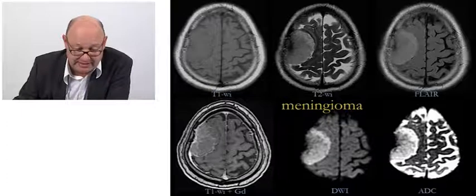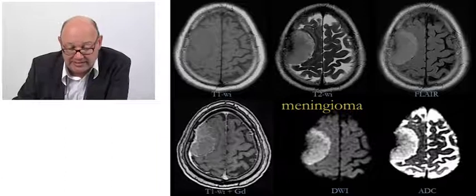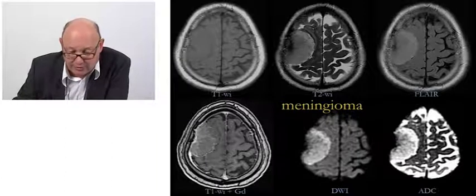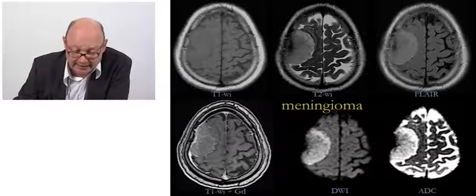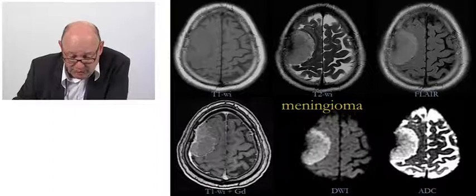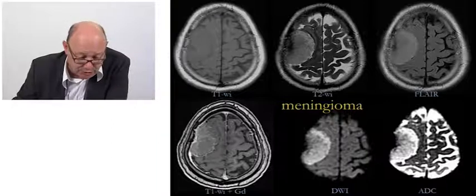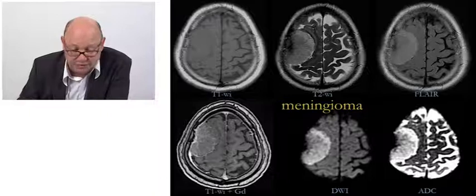There's another case where you see a patient with a mass lesion. Always ask yourself the same questions: supratentorial or infratentorial? Well, it's supratentorial. Is it intraaxial or extraaxial? Well, actually, it is outside of the brain. It's an extraaxial lesion. It's in the frontoparietal area of the right side of the brain. You see some pattern of hypo-intensity over here. You see there's restricted diffusion with high signal intensity on diffusion. Well, also the enhancement pattern, we see there is a dural tail. If we have all this information together, this can be only one thing. This is a patient with a meningioma.